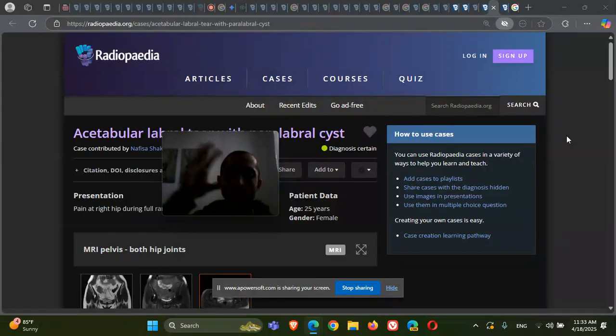We talked about intracapsular area compared to extracapsular area, which is important because avascular necrosis happens more commonly in intracapsular fractures, namely head or neck fractures, and the basicervical region is the limit. Some say it's extracapsular, some say it's intracapsular, even though orthopedics says intracapsular. I don't know. Basicervical region is the limit.